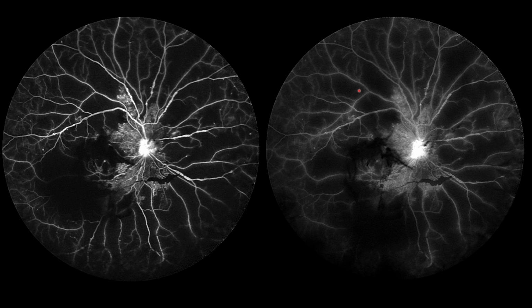So you can make out these black areas. These are all areas where capillary non-perfusion is there. So diabetes has caused blockage of the normal capillaries and causing severe ischemia in the retina. So this is how we can assess the angiography step by step.